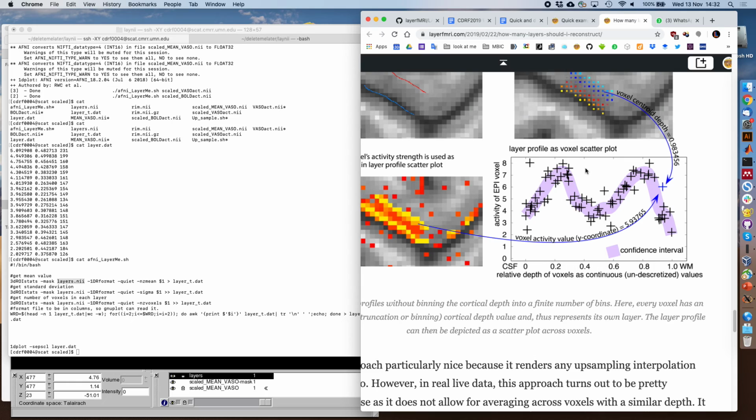I think the long-term goal is to somehow relate the function to something else. So if you see a shape like that, you also see a shape like that in anatomy. Or if you went to another data set, I don't know, spine density or something like this. We don't have that, so it's relatively exploratory. In that sense, it makes sense to just report it as an exploratory analysis in a lot of ways. But beyond that, we want to lay the groundwork so that we can make these relationships. Exactly, I agree.